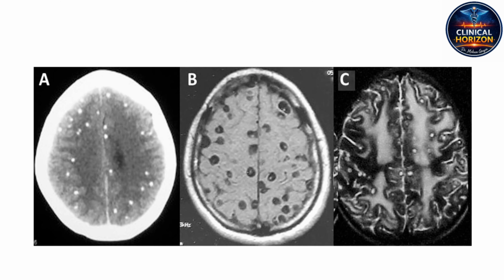As long as the parasite remains alive in that vesicular stage, it expertly evades the host's immune system, and the patient may be entirely asymptomatic. But eventually, the larvae begin to die. And that cellular death triggers a massive local inflammatory response from the host, which ushers in the colloidal or degenerating stage. That's where the scan changes dramatically.